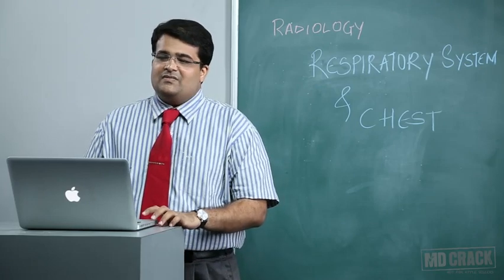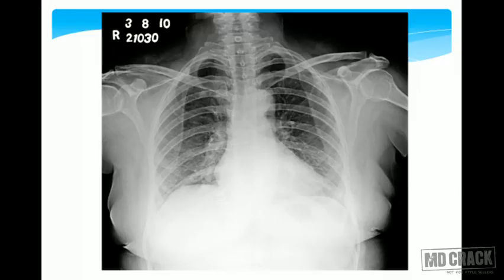So starting with, this is a frontal radiograph of the chest. The first thing that you look for is the right side marker, the date, and the registration number of the patient. Nowadays, a lot of x-rays may have the registration number down here at the bottom, but it's immaterial. You need to look for these things, because that will tell you which side the lesion might be, what is the actual side of the patient, the right or the left. You might either have a right marker or you might have the left marker. So this is what you have, your right marker, like I've already pointed out.